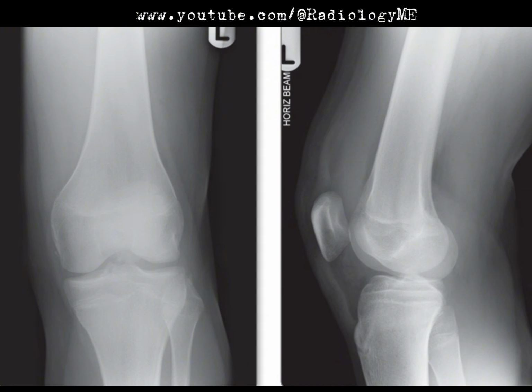Another thing they might ask is, what about ligamentous injury? Why are you concerned? Well, with a Segond fracture, there's a super high association with ACL tears and even meniscal damage. This isn't just a fracture you treat and forget about. There's a lot of soft tissue involvement that we need to address. And that's exactly why the MRI is critical.